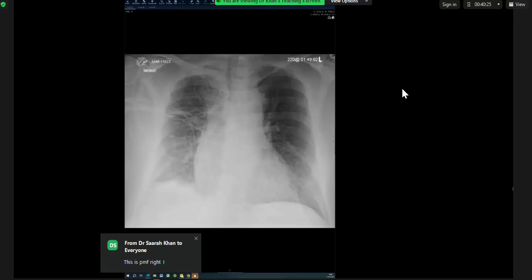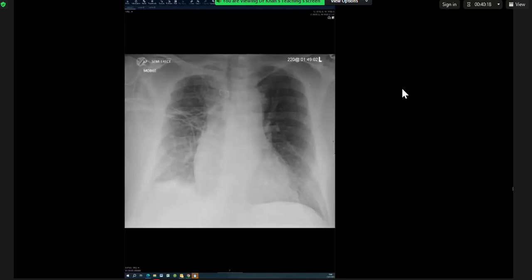This is a frontal radiograph of the chest of a patient who is in heart failure. I see that there's no pneumothorax, pneumomediastinum, or pneumoperitoneum. I see there are multiple external leads and midline sternotomy sutures. Looking at the lung fields, there are prominent vascular markings. There is cardiomegaly, there is unfolded aorta. The bones are normal.